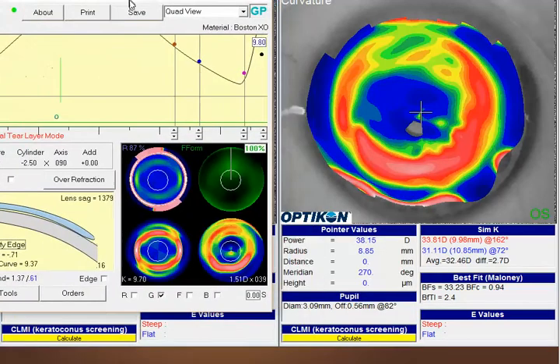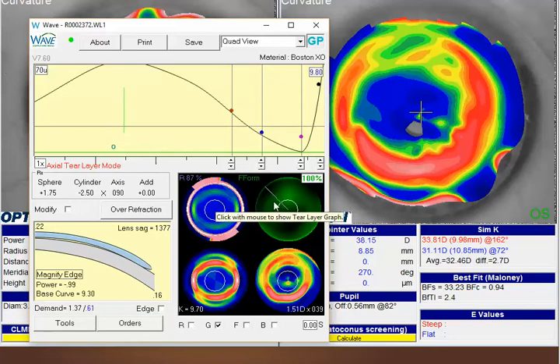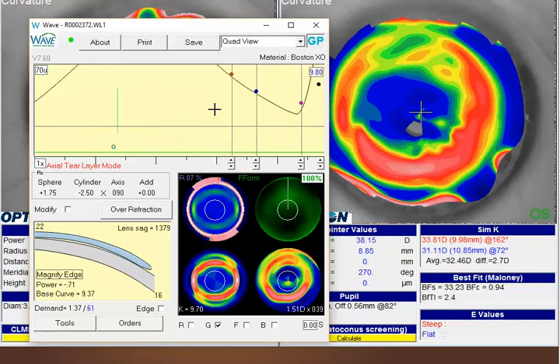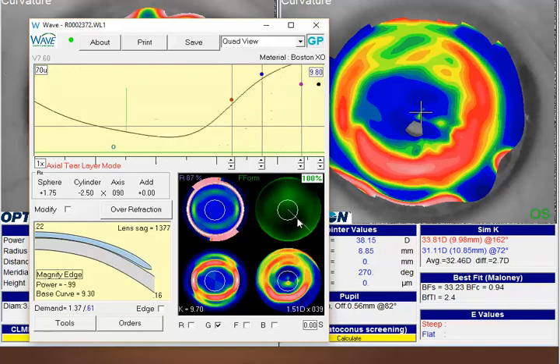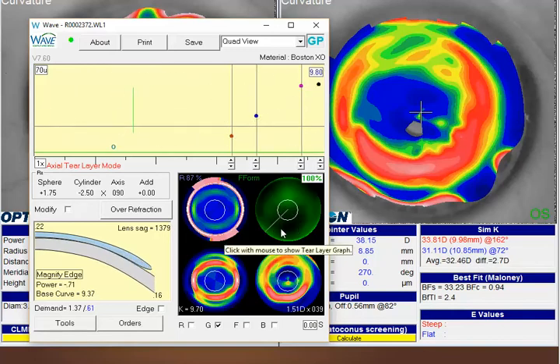So if we look at your design for a moment, remember this green line on the top view is the corneal reference line, and if you take your radial control and just rotate around, two things you'll notice: centrally you have a lot of area of clearance within this optical zone, and it's also very inconsistent. So you have peaks and valleys through there. And then if we look at your landing zone, which is basically a blue to pink dot, you'll see that's also quite inconsistent. And that's one of the disadvantages we'll have with trying to do either a RSIM or GSIM with such an irregular cornea.